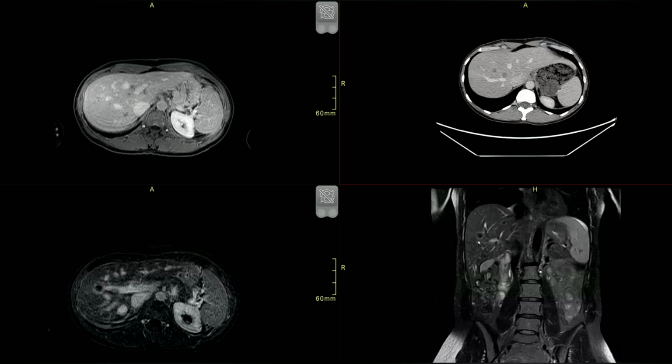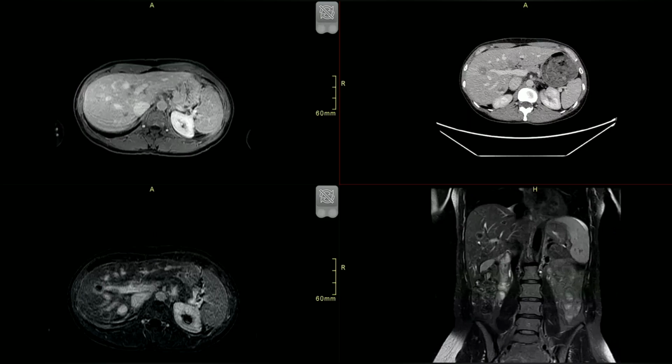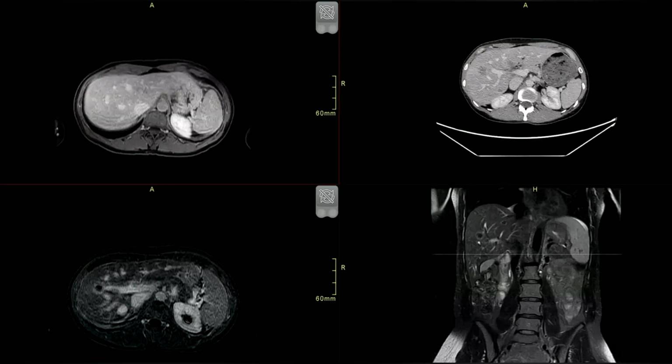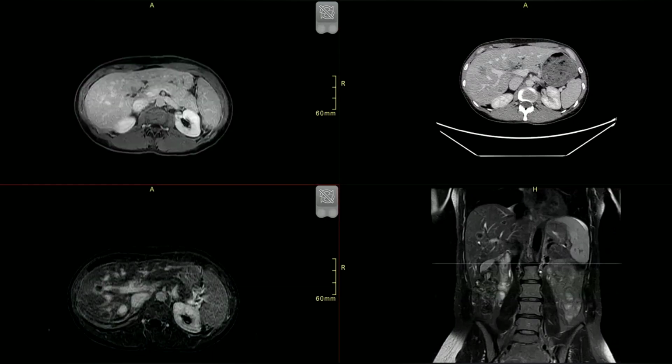They are by themselves because you can see the vessels. And the bile ducts are not dilated. You can see hypodense lesions within the liver, which are showing subtle intravenous contrast enhancement as well. And on MR post contrast images, the lesions are again showing subtle post contrast enhancement, and they are randomly scattered within the liver, mainly the right lobe.